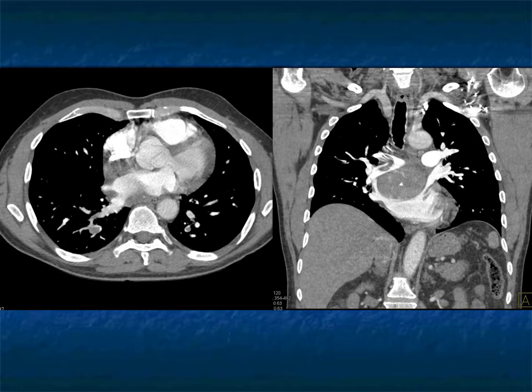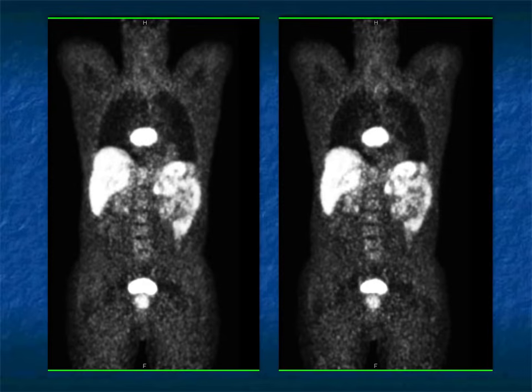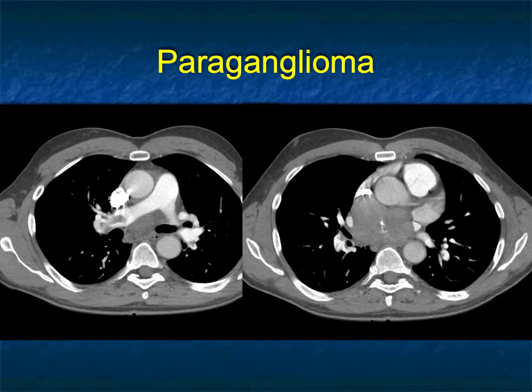This is mildly vascular. This ended up being biopsied. This was not lung cancer. It was not lymphoma. Here it is very, very hot on the PET scan in the mediastinum, right, in the heart, and was a paraganglioma. Paragangliomas occur in the mediastinum, usually toward the AP window, but they can occur other places. The thing about paragangliomas, which are extra-adrenal pheochromocytomas, typically they're very vascular. This lesion has calcification, but it's not very vascular. So a very unusual case, something worth thinking about.